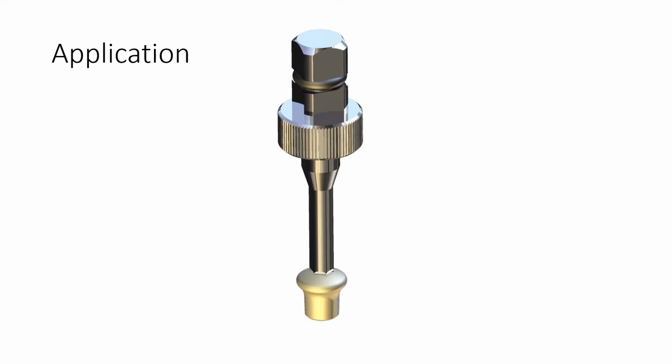Before using the universal extender or driver, you must make sure that the little black O-ring here is in position. This helps to retain the universal hex tool in the driver or in the instruments that you might be using it with, and if this is either worn or lost, then obviously the tool will not be securely held in the instrumentation and could be dropped into the patient's mouth and inadvertently inhaled or swallowed, causing an emergency visit to A&E.